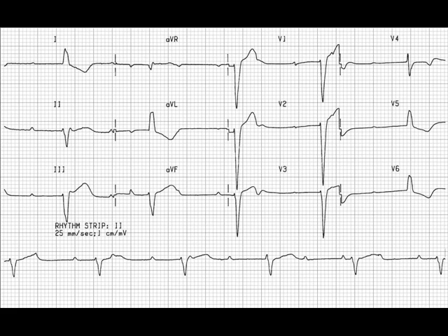Is the patient in sinus rhythm? Well, have a look at the rhythm strip, and luckily it's lead 2, printed there along the bottom of the 12 lead. And certainly we have P waves, we have sinus activity. But your eye will already be saying there's a rather odd association between the P waves and what appears to be a rather bizarre QRS complex. Well, let's pick that apart.